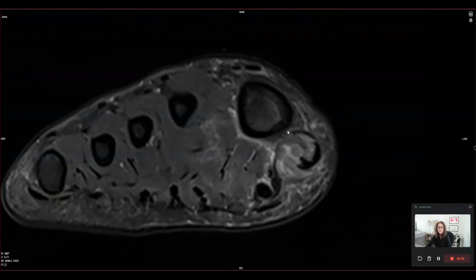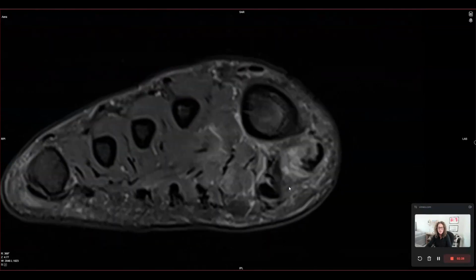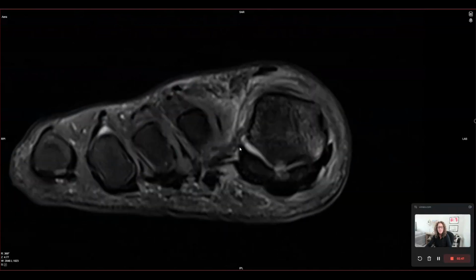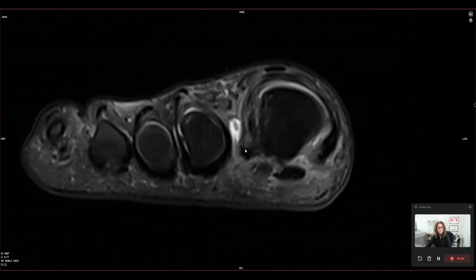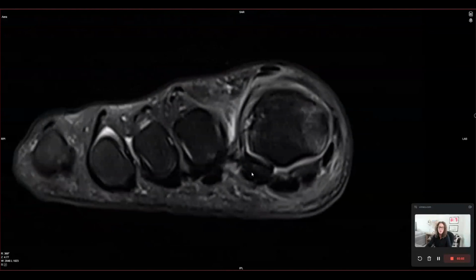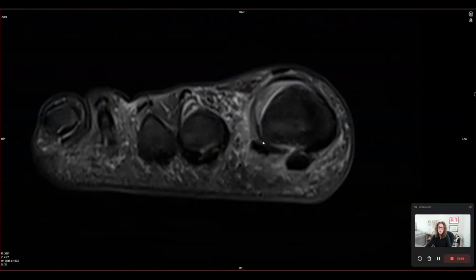What we can appreciate is the myotendinous grade 2 partial tear of the abductor hallucis muscle, and even the edema that it is extending towards the flexor hallucis brevis, which is intimate at this location. So we see those myotendinous injuries along that muscular support. Looking at the lateral flexor hallucis brevis tendon, we see that's further reinforced by the conjoined tendon band of the transverse head of the adductor and the oblique head of the adductor hallucis muscle, further joining the flexor hallucis brevis, attaching then to the proximal phalangeal base.